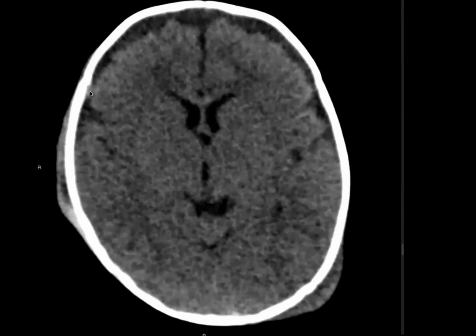Yes, sir. And plus there are bilateral subdural, sir, prominence of the extra axial spaces. So they can also be subdural hygromas, or chronic SDH due to any history of any previous injury which this child may have suffered. Okay, so you've mentioned what you want to do in terms of management and where you want to send it. You've done all that. Is there any other imaging you want to do apart from the skeletal survey, which I've already talked about? Sir, I would also like to go for MRI brain imaging of this patient.